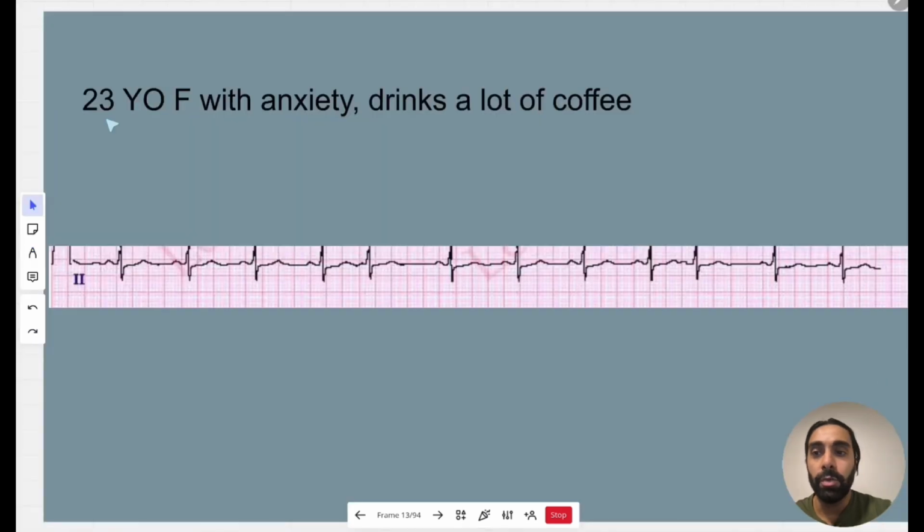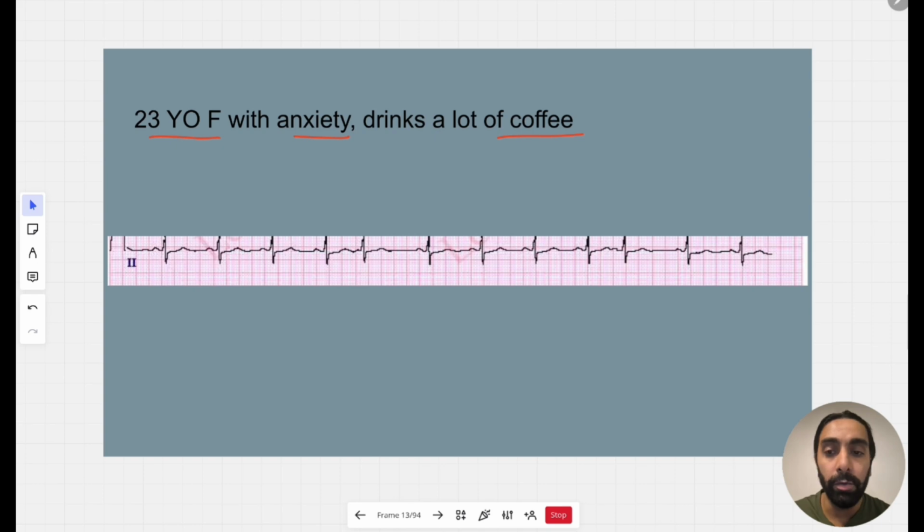Alright, so we have a 23-year-old female with anxiety who drinks a lot of coffee. Go ahead and review this EKG, pause the video, and then come back to me for the answer. So there are 12 blips on this 10-second lead, so that is normal. We can't do axis, so we're going to focus on rhythm.